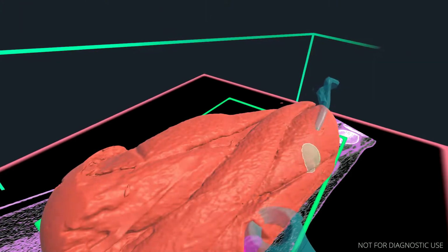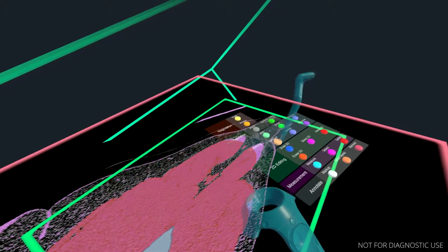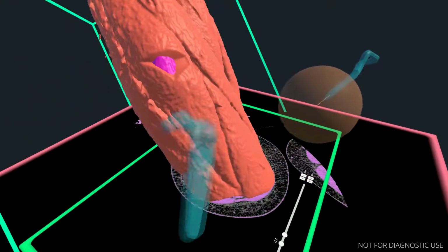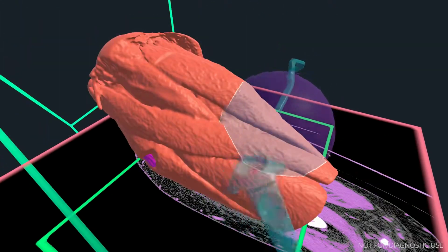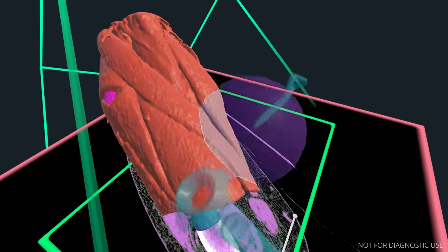Okay, add in this bit there. Subtract out this guy. And then just to make it look a bit better, we'll do a denoise on this to pull out the average structure, basically.